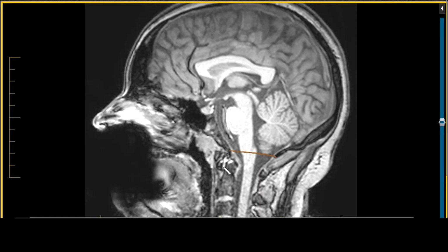And then we've got the anterior tubercle of C1, the atlantodental interval, which we pay careful attention to in rheumatoid arthritis, and the tip of C2. And there are some membranous and ligamentous structures we'll tackle in the cervical spine talk and vignette. We've got the anterior arch of C1 as mentioned, and the posterior arch of C1, the posterior arch of C2. Don't forget to look at the sphenoid sinus and the frontal sinus. The clivus is a particular area of consternation.